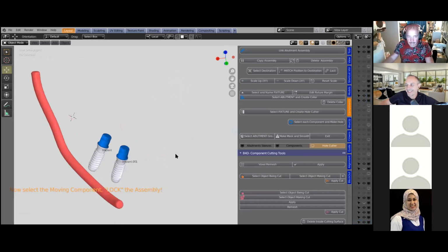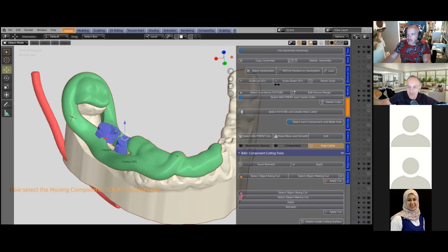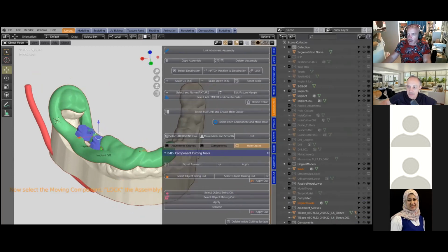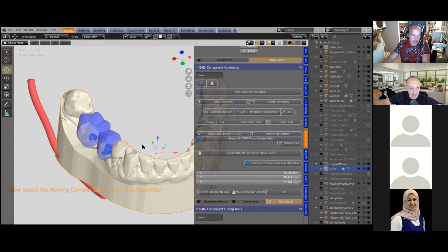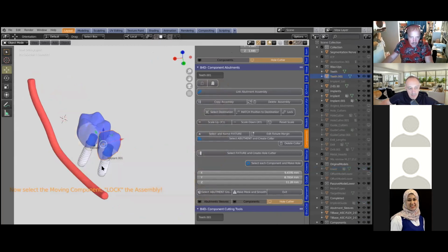And now, well done. Can you put a crown on it? Yeah, okay. I've got to look for my teeth. Let's have a look for my teeth. Okay. Here, wax up, teeth. Here we go. All right. Let's hide everything else so we don't see it. Okay, so hide this. H to hide. Okay, so we've got that one.